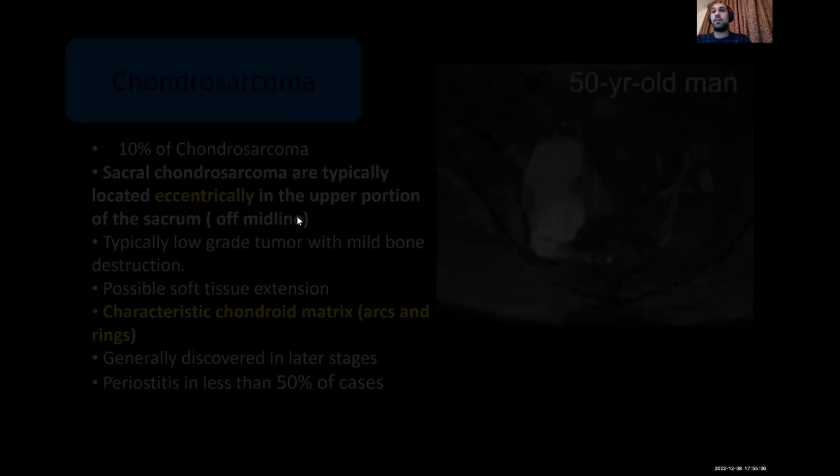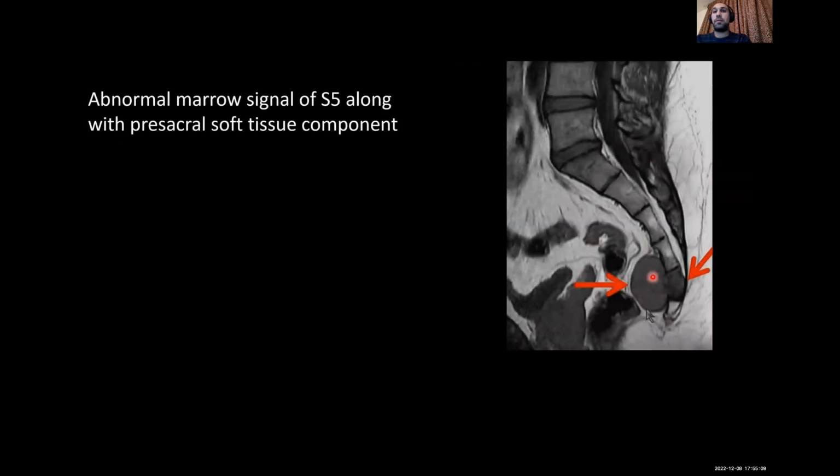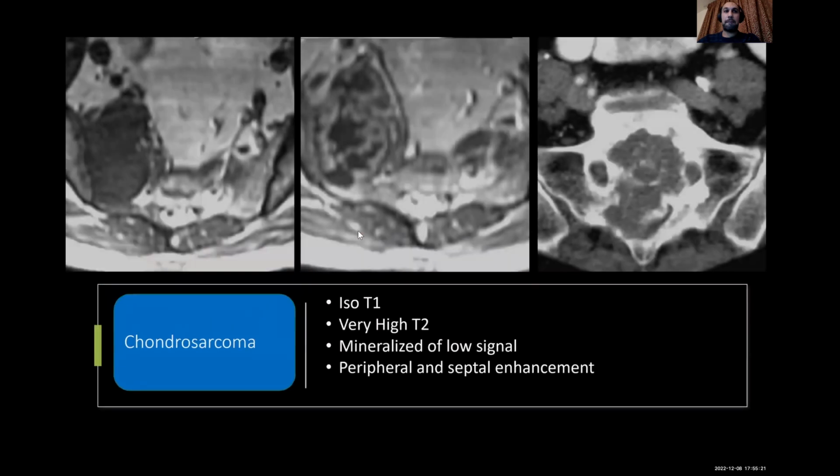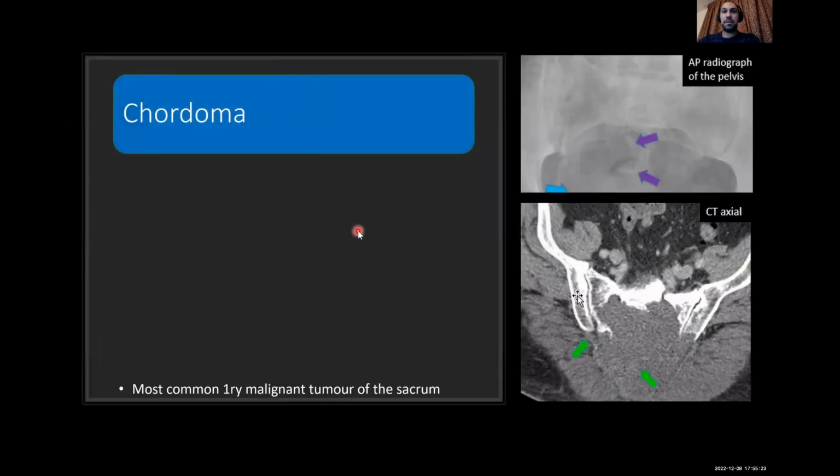Chondrosarcoma. But this is not chondrosarcoma. Here it is chondrosarcoma. This is chordoma. And this is the... I will show you the answer.